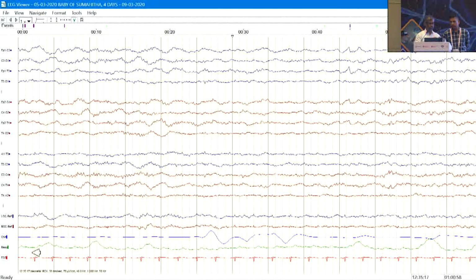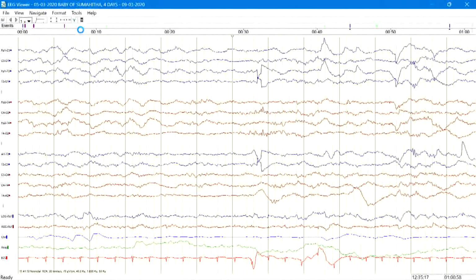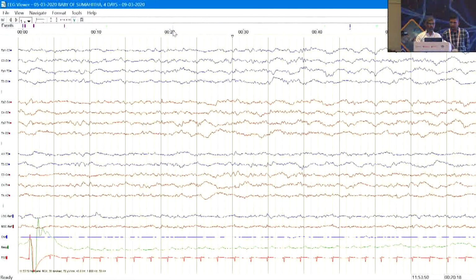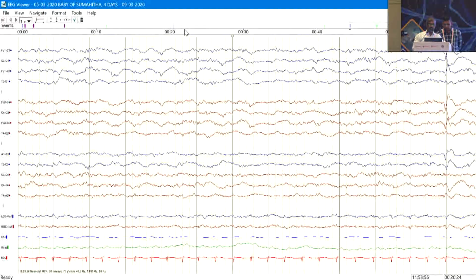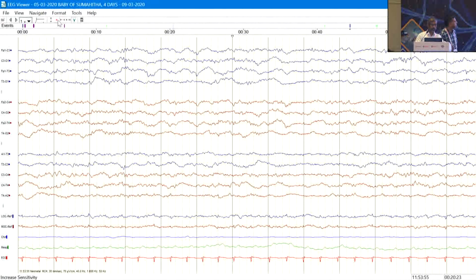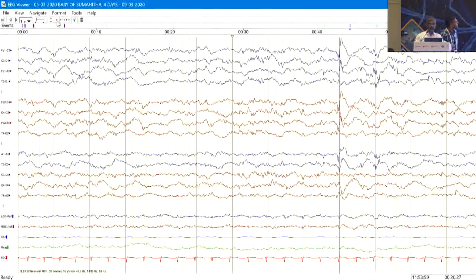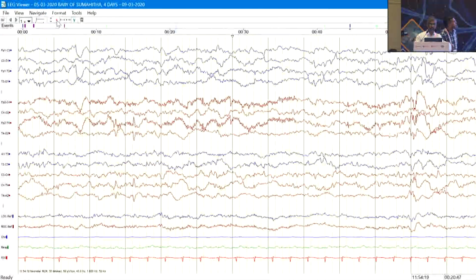Okay. So since the neonatal EEG we have seen at the end of this presentation, we'll see one recording where we see the live reading session of the neonatal EEG before we move on to a slightly older age group. So here you can see, is it continuous or discontinuous EEG? This is continuous, okay? So we are clear about what is continuous, what is discontinuous. Okay, right. So I'm going to go forward. Let us see, is there any discontinuity at any point?